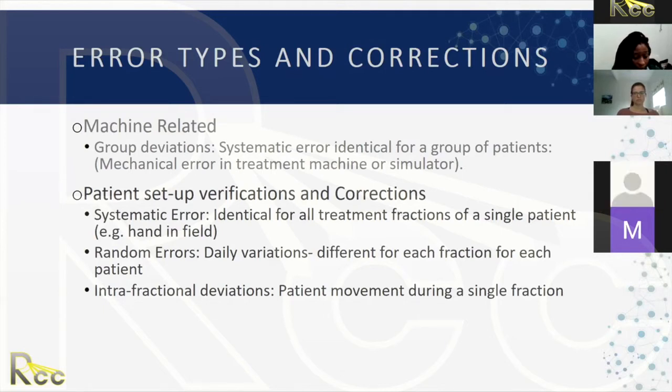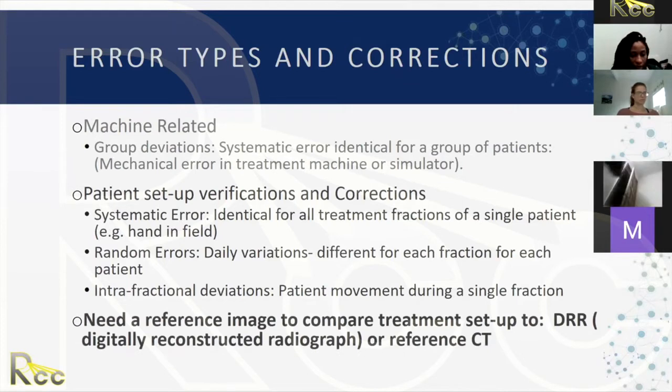But to be able to fix any of these errors, you really need a reference image to be created, and that's what you compare to your treatment setup, right? So you either have a digitally reconstructed radiograph or a reference. This is important to compare your treatment setup to.